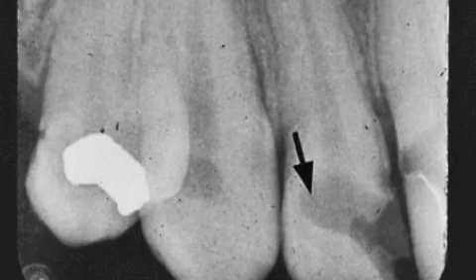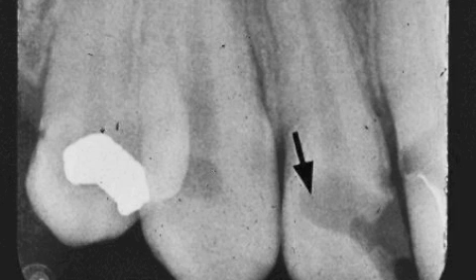This arrow points to a radiolucent anterior tooth-colored restoration. We know it's a restoration due to the cavity prep. Notice how on the mesial the restoration is very dark, and that is because the entire tooth, facial to lingual, is restored. The mesial cervical of this tooth has recurrent caries, as well as the distal cervical of tooth number 8.